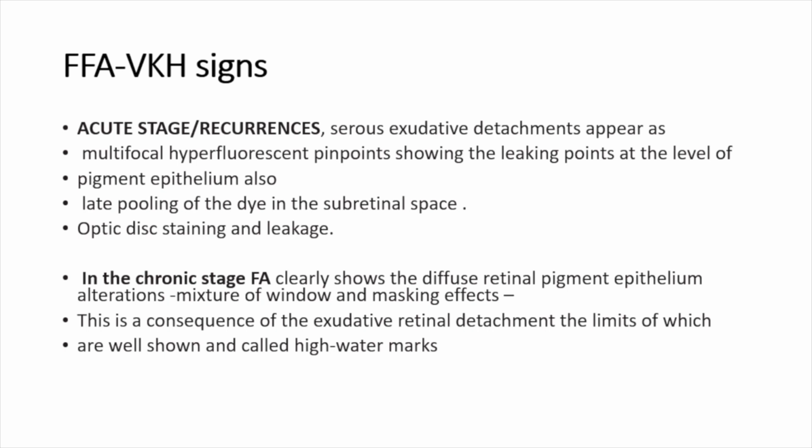There is also optic disc staining and leakage. In the chronic stage, there is a mixture of window and masking effects because of the diffuse RPE alterations. This is because the exudative RD is settling, the limits of which are marked by high watermarks.